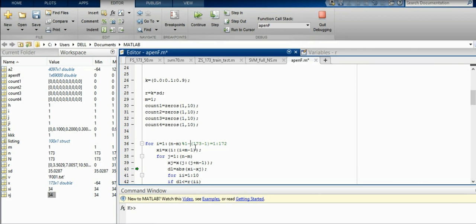Okay, here n is equal to 173 and m is equal to 1, so 1 to 172 values are compared with the other 172 values, because a frame can contain the 173 values, right? So we can get one value to 173 values, and call them one by one.